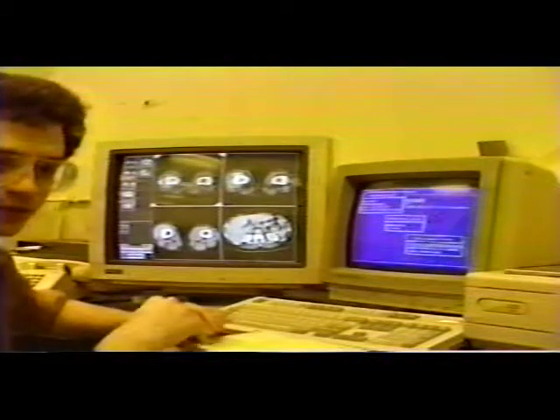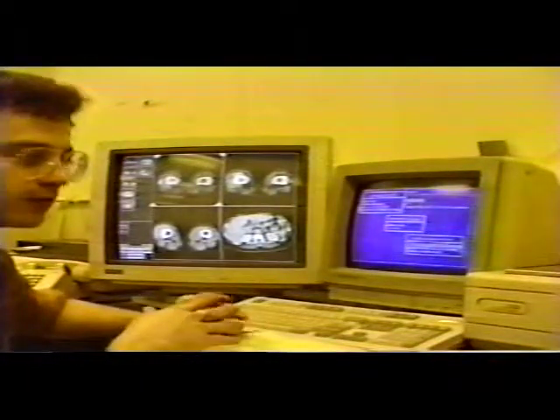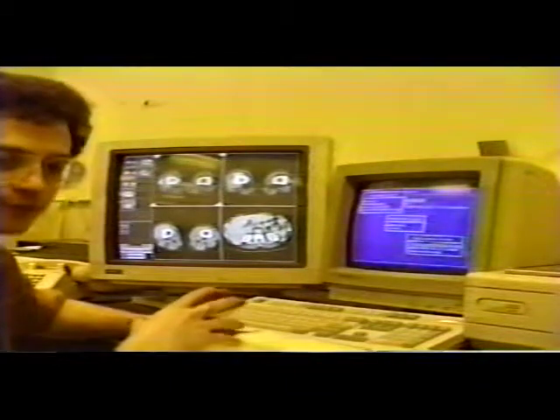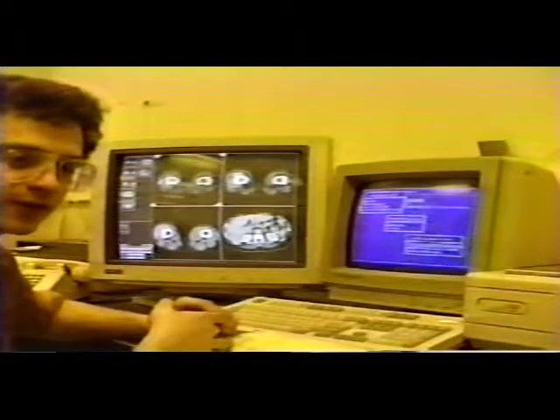And the file system, in addition to allowing you to easily access all of the regions of text and fields, also is redundantly storing information on it. That means that every file header, every text block is stored twice. Even if the disc is mutilated, that won't be a problem in most cases.